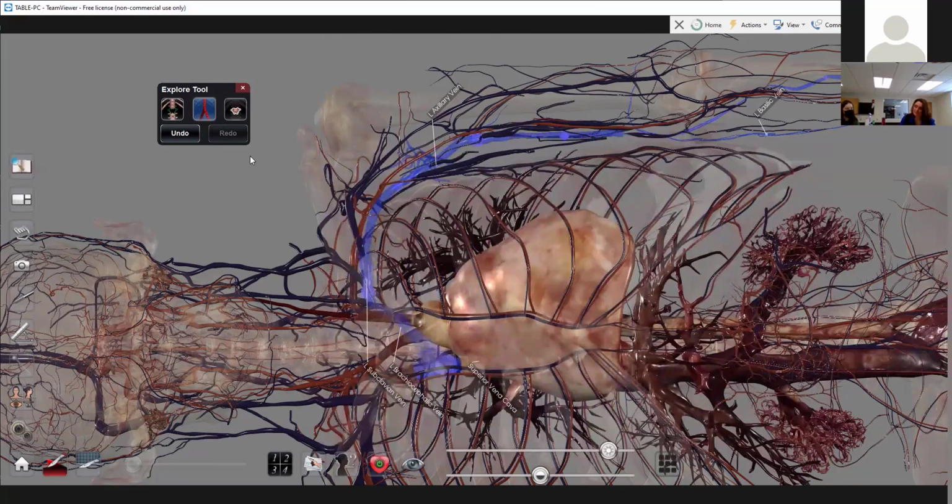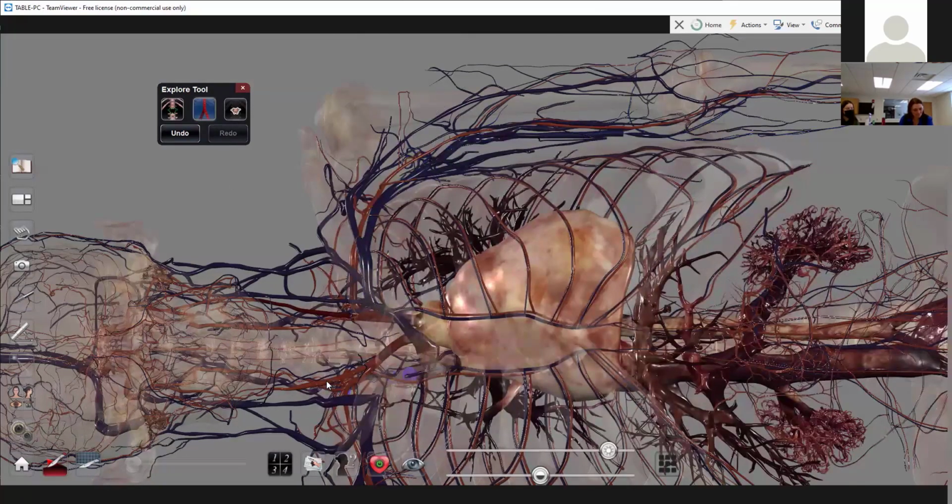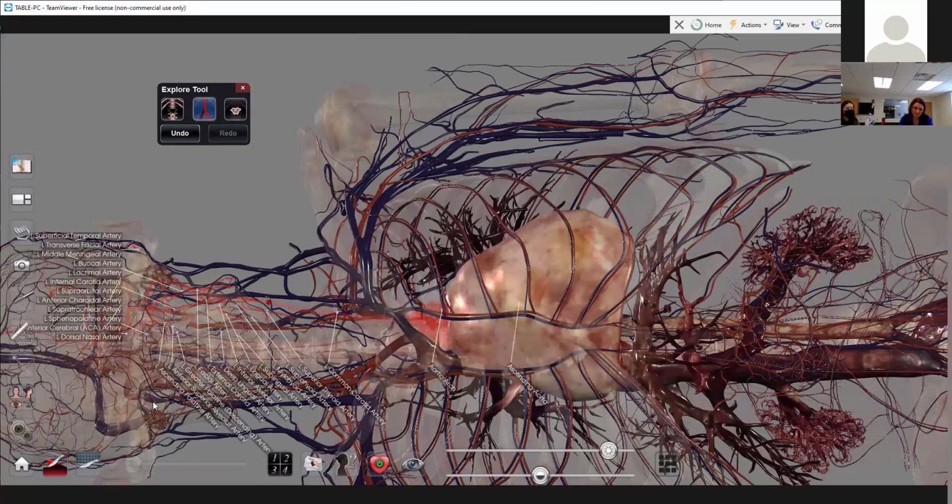And the same rules go for arteries. So I could tap next. Where is there an artery? Maybe right here, and you can see that's a lot of annotations because the blood flows through a lot of structures, but let's get this guy. We have this blood flow all the way to the heart. We have it all in red, so this is a pretty intense blood supply, but if we wanted to, we could look at every single artery that we're going through.